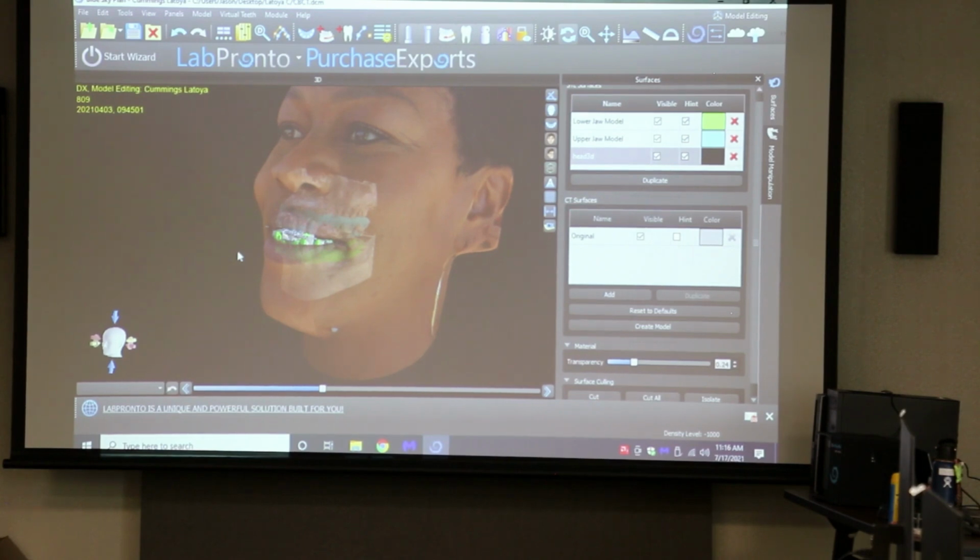You can rename it to anything you want, like, just make it face scan, and then you use these big things. So that's where you can just sit there and try to slowly figure out your own patient. But if you have a face scan and your DICOM comes up, you're gonna step by step, kind of like a trial and error. And we don't have enough data to do this really, really well.